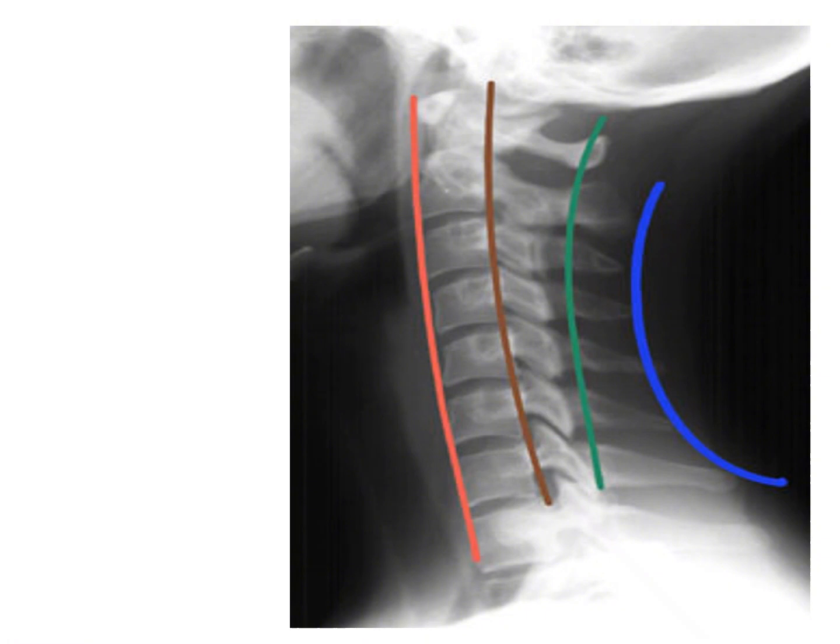The posterior vertebral line or George's line is formed by the back edges of the vertebral bodies. We can see here this brown line is the posterior vertebral line, and it should also follow the same curve. The spinolaminar line is the line drawn from the posterior edges of the spinal canal.